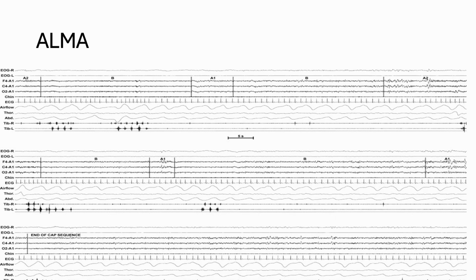Here's an extended look at a study. The important things to notice are the little black blobs. One there, one there, one there, one there, one there, one there. Usually the legs are going one after another, but there is a cluster where it looks like they're going together right there. But then they go back to alternating again.